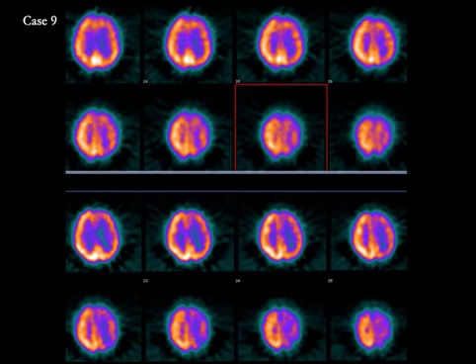We rarely do brain perfusion studies using acetazolamide or Diamox to evaluate cerebrovascular reserve. The physiology of these studies is similar to doing a cardiac stress test, where we inject a vasodilator and then we inject the tracer and we see if any flow heterogeneity has been induced by vasodilatation.